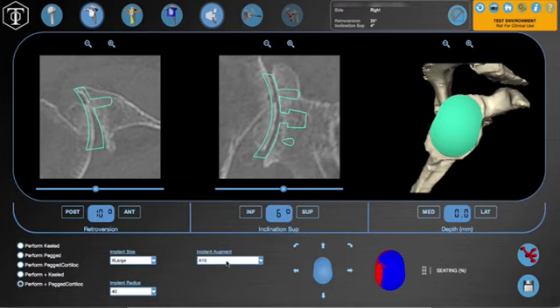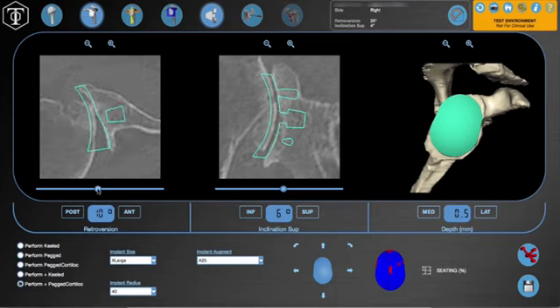So I'm going to go ahead and play around with the implant augment a bit more and change it to 25 degrees. You can see that that automatically jumped me up to 99% seating, but my implant's a little bit medialized, so what I'm going to go ahead and do is lateralize that just enough that I feel like it's maybe seated right on that subchondral plate. So you can change the medial and lateral depth of the implant. Here we're at 0.5 millimeters of depth, we have 93% seating, and as I scan up and down, we're pretty much sitting right on the bone.